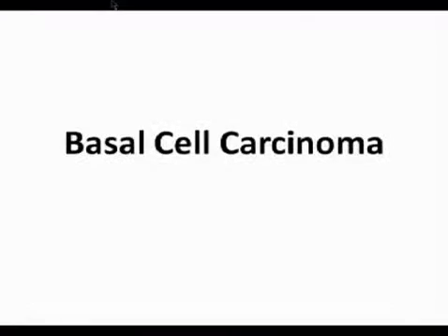And again we have the same pattern as seen in the basal cell carcinoma before, and we have the same clues. We have clots, and we have ulceration, and we have white lines. White lines are not specific. They can be found in melanoma or basal cell carcinoma or other malignant lesions, but the diagnosis here, according to the vascular pattern and according to other clues, is basal cell carcinoma.